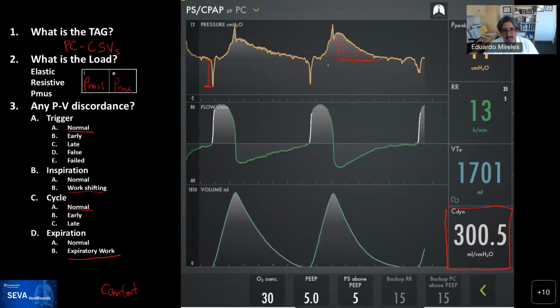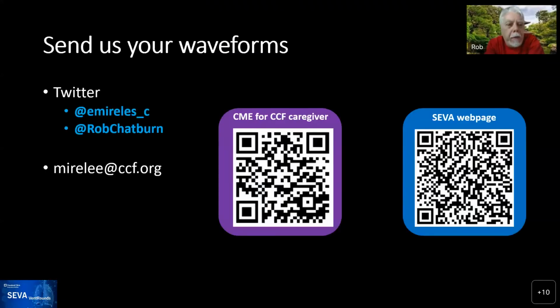Because the ventilator is essentially not providing any support, the ventilator is calculating the compliance for this patient as 300, which is pretty unlikely to be the case. Yeah, they should have some override algorithms in there that say don't calculate dynamic compliance if you have a P0.1 greater than some number, right? Right. Because again, the ventilator doesn't know the difference between a high compliance and a high effort. It all looks the same to it.